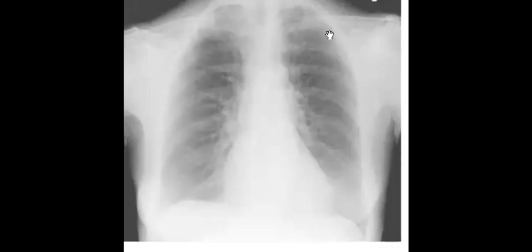Then now your role is to say rheumatoid arthritis. This is the R of SHIRT. SHIRT is the word you remember for the differential diagnosis. So R, rheumatoid arthritis. If it is rheumatoid arthritis, you will search for erosions and joint space narrowing, especially in the glenohumeral joint.